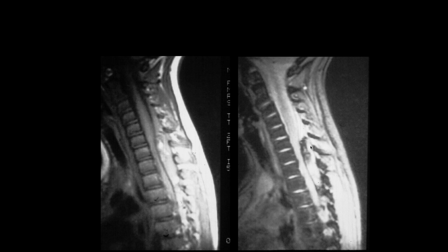I think it's hemorrhage. It's epidural. Which space? That should be epidural. Yeah, it's outside. Well, I was going to say, does it look infectious? And obviously not. Yeah, this is pretty typical of hemorrhage. Now this actually was drained surgically, and they confirmed that it was an epidural space.